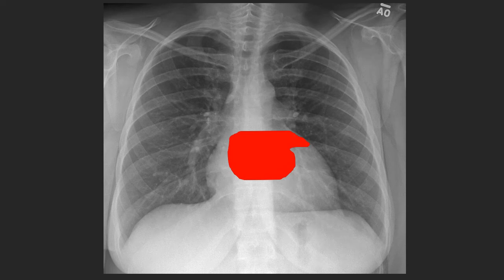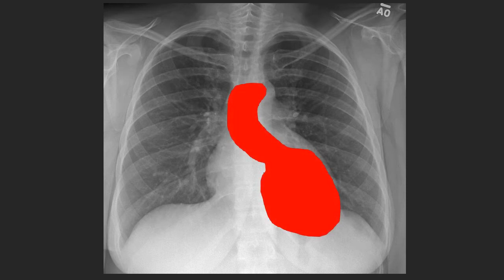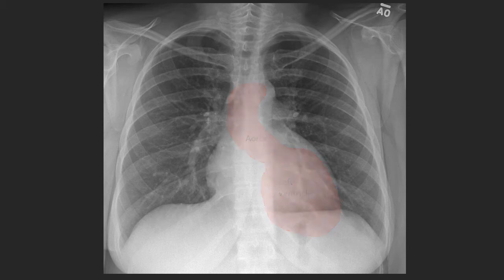The left atrium is the most posteriorly located structure in the heart, and it's going to be in red because it's receiving oxygenated blood. Typically the left atrium is not going to be contour forming, with the exception of this little appendage that sticks out here known as the left atrial appendage. So that portion of it will be contour forming. The left atrium then will dump blood into the left ventricle via the mitral valve. Your left ventricle forms the majority of your left heart border. The left ventricle will then pump blood into the ascending aorta.